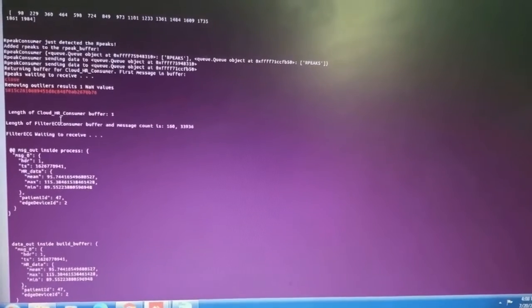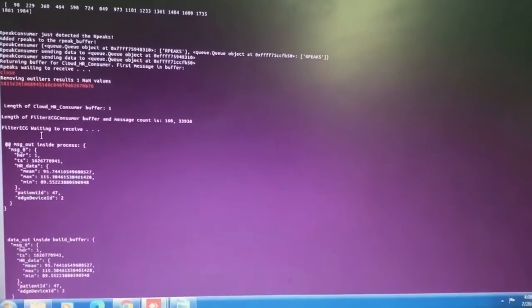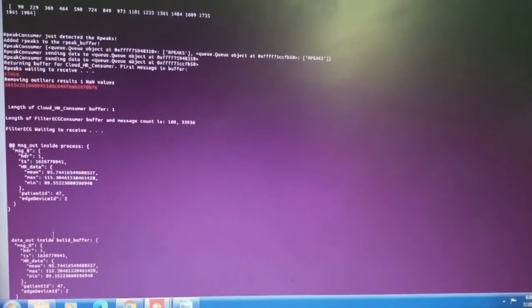Now here you can check the hardware device data on the IoT core console. This is the device data, so the device data is pulled and can be seen over here. This is actual device data which has been pulled and shown over here.